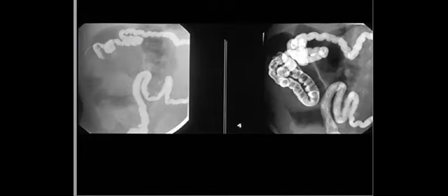Meconium ileus. So how do you describe it? You describe that it is a microcolon, right? And you will find some filling defects within, in the right hemicolon. Is it a long microcolon or a short microcolon? It is a long microcolon, perfect. With a long microcolon, you are talking about either meconium ileus or distal ileal atresia. So how do you differentiate between both?